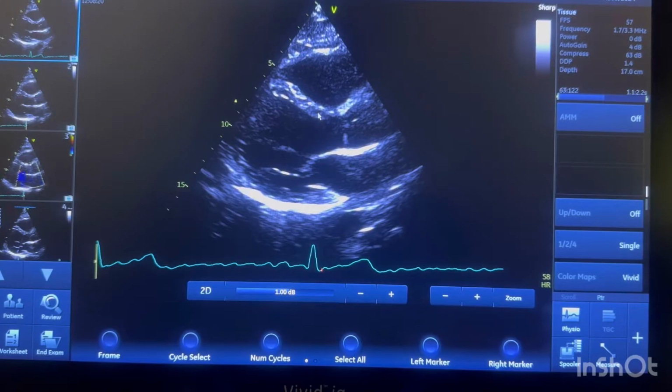You measure it here to here, and then this is a very important part here, because you are not sure whether you should be measuring from here or somewhere here. These are the trabeculations, but if you look at the wall, this is the continuity of the wall, so it goes this way. There is a bit of dropout, but this is clearly the wall. So you need to be measuring from here to here. So you go into measure.